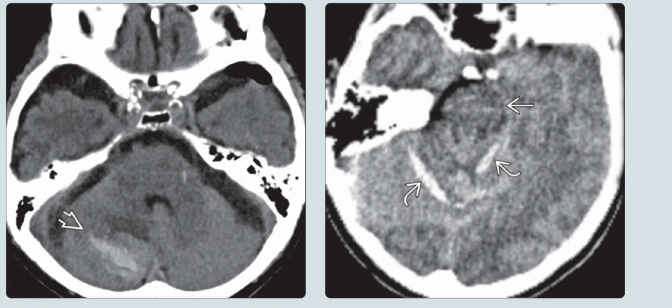Left image is the axial CT scan, and it shows the right cerebellar hemorrhage in this 86-year-old patient who underwent left-sided burr holes and catheter placement for the drainage of a left subdural hygroma. This hemorrhage was found incidentally. Most patients need no intervention for the cerebellar hemorrhage.